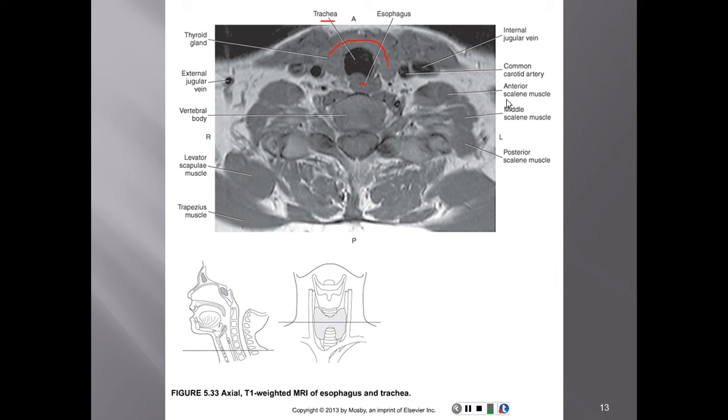And another group of muscles that's important is the scalene muscle. So you have the anterior, the middle, and the posterior scalene muscles. That's the group. If my outline is not precise, forgive me, I'm doing this with a laptop. So you should be able to look over here and find the corresponding muscles. But the scalene muscle group is important. And you have the anterior. You can break it off here, break it off there. You have the middle, and you have the posterior group.